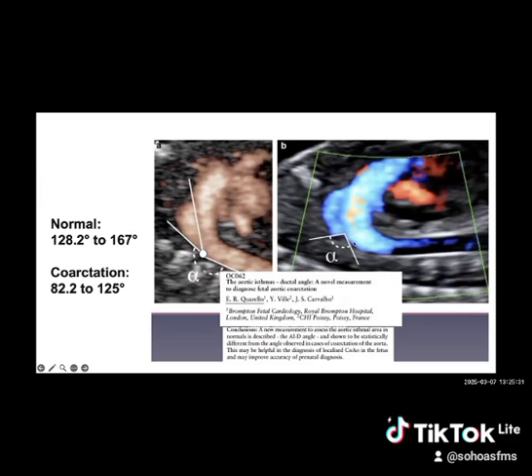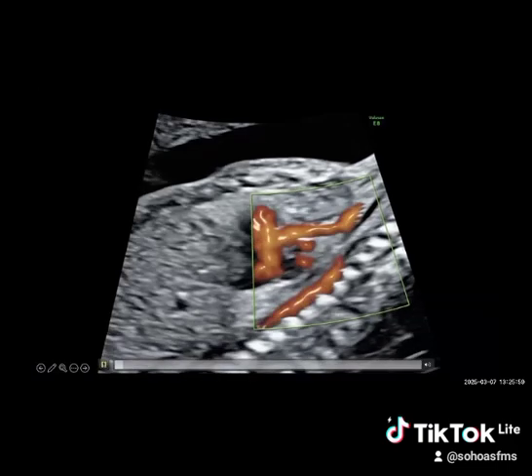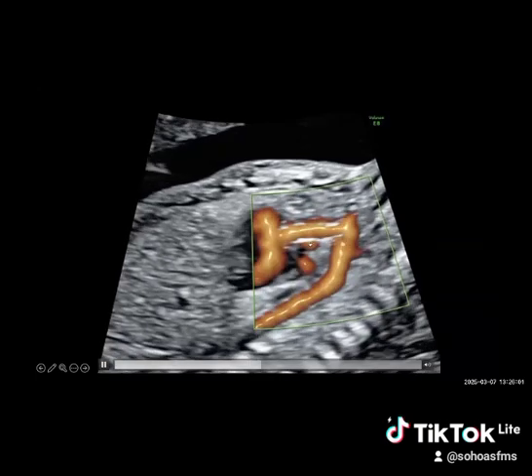Not all of these findings are always present in every patient. Some patients present only with hypoplasia, some patients present only with disproportion, no posterior shelf, normal Doppler. That's where the challenge begins, and where the patient then needs to be stratified. The risk of coarctation may not be high, and prostaglandin is not started, but rather postnatal assessment in the first day or first hours of life.